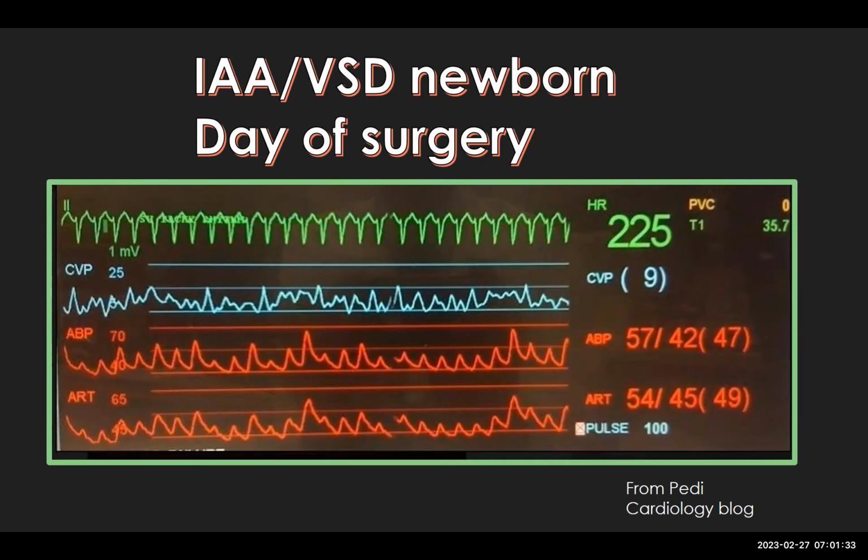So it's obviously a tachycardia. I don't think I see, trying to see in the tracing like P waves, but it doesn't look that way. And then given the history of the VSD, one thing I'll be concerned of is going to be JET. Yeah, so then two things will help us with that, looking at the CVP tracing, I think it will be fair to say it looks like cannon A waves, probably the middle ones.